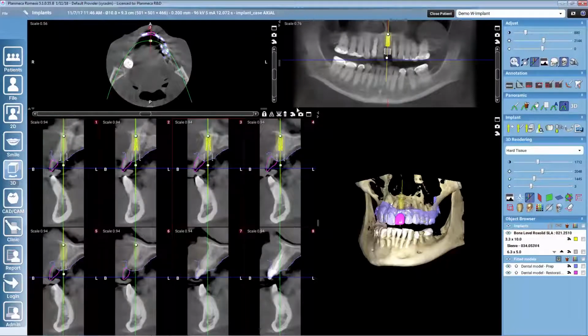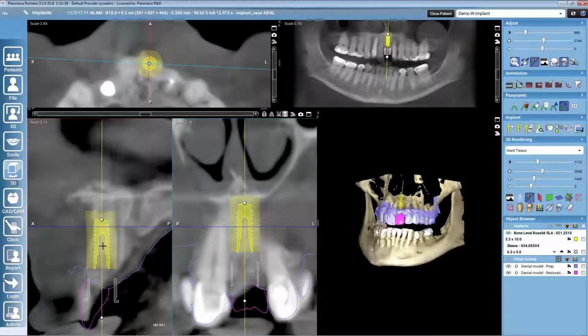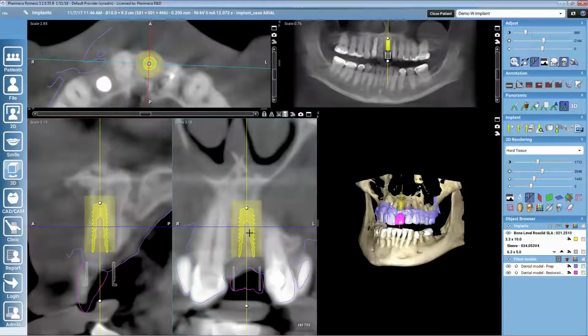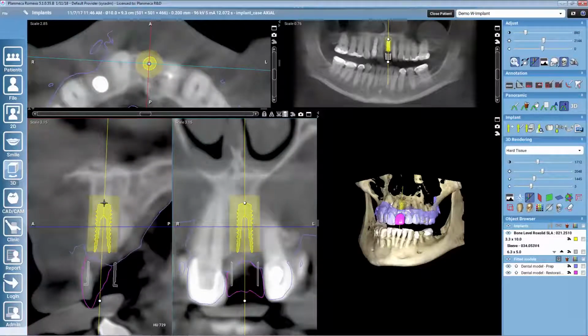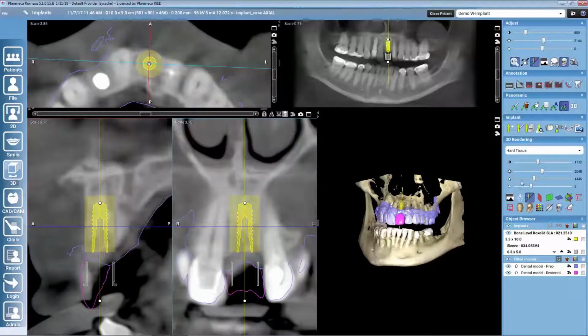and then I will use this implant centric view to place well the implant. So these 2 slices are always centralized in the implant, and I also see the cuts from the restoration design here, so I have a good overview on how I want my implant to be positioned. Once we have found the good place for the implant, then we can look at the sleeve.